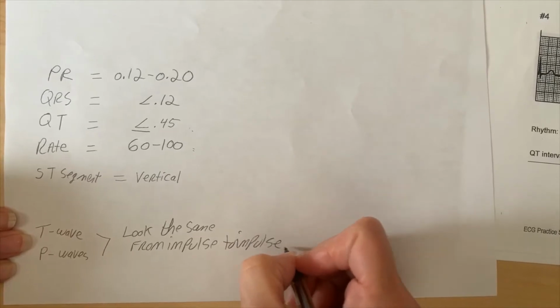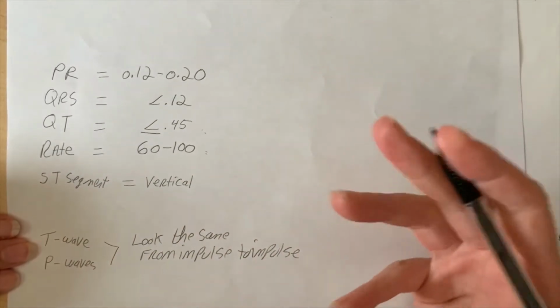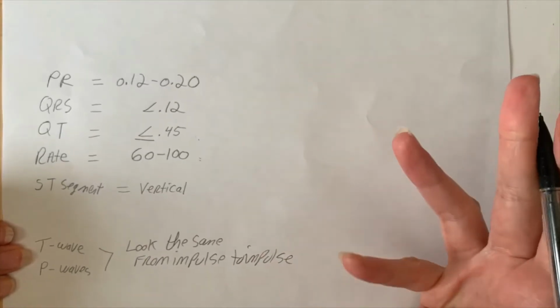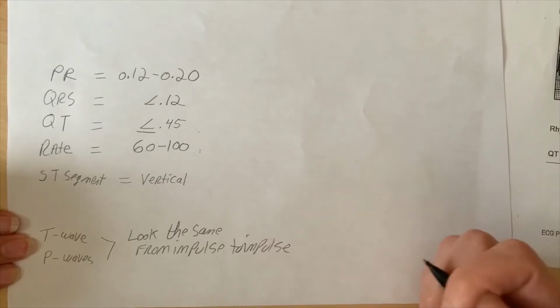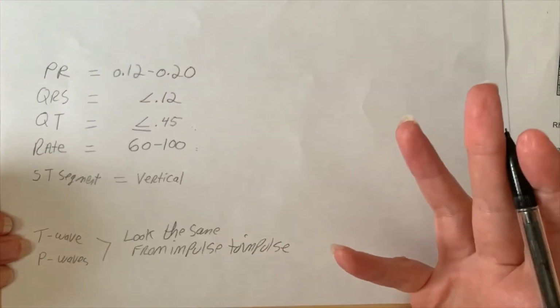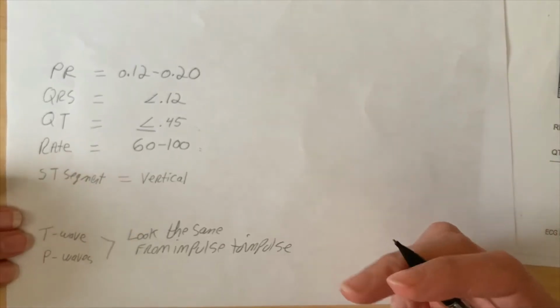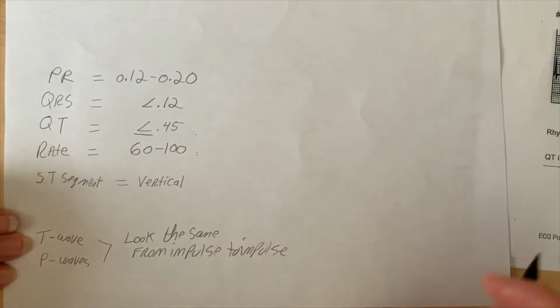And I know we try to shy away from the term normal in nursing, but in this case, that's really kind of what you're being asked: does this T wave seem normal? Is it too tall? Is it peaked? Is it inverted or upside down? Not how big is the wave, just if it looks funny is mostly what you're looking for.